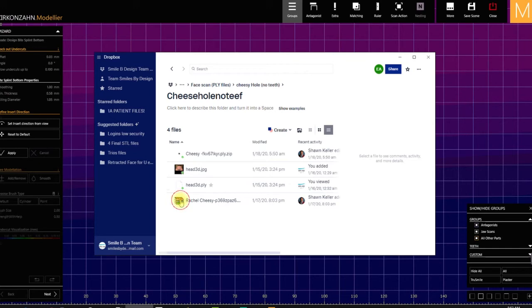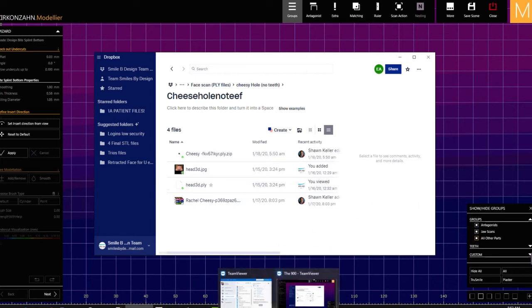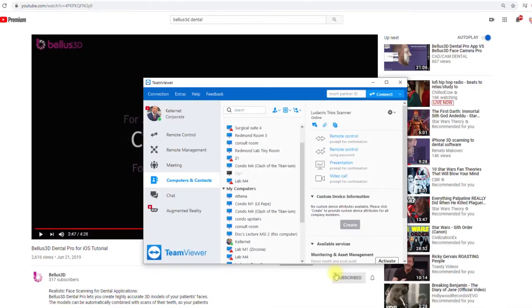I'm double clicking on it, maybe it's here. Did I jam my computer? I think my connection might be out now because I could see it on my other computer. It's working fine. Timeout. Okay, let's go back to 900. So every now and then that just happens, and it's not the computer that's jammed. It's your connection with the TeamViewer.